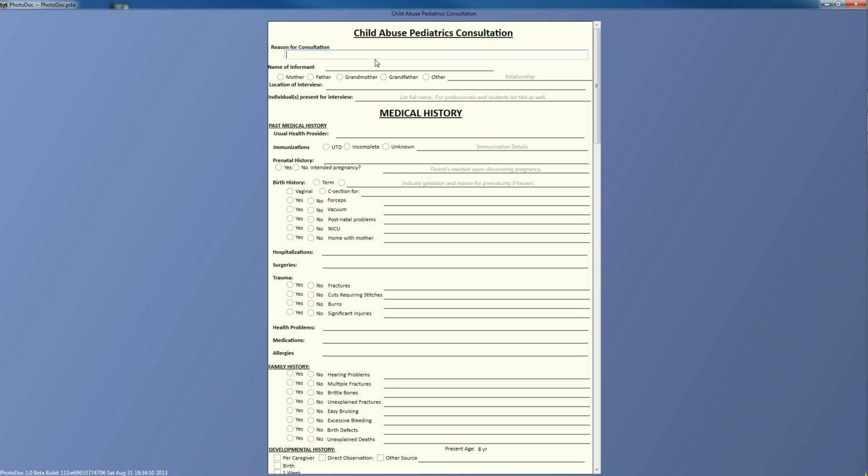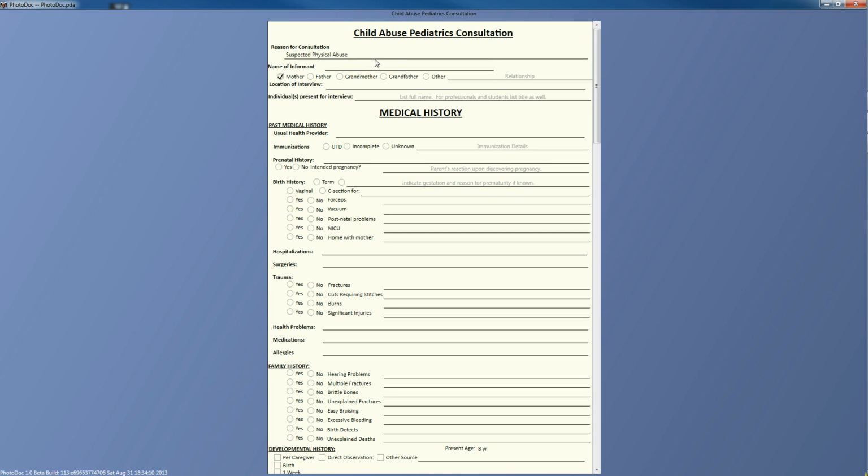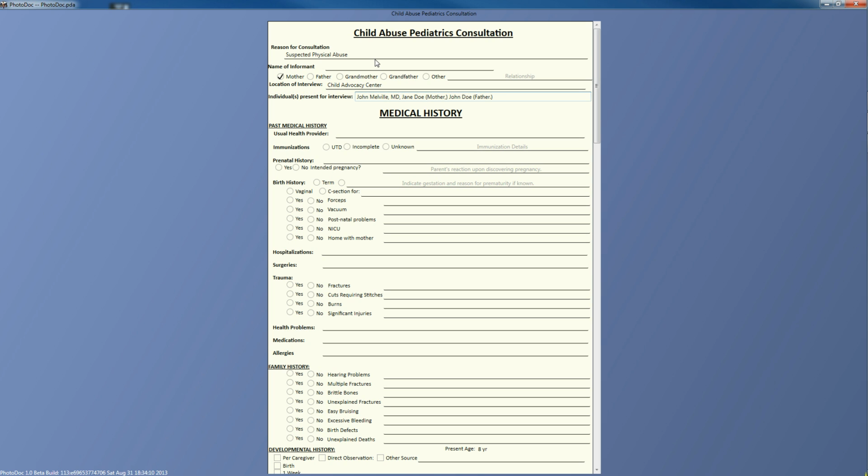Additional helps like macro phrases, checkboxes, default fields, and my favorite, copy whatever I wrote on the siblings chart, make it easy to complete much of the charting while I am doing the interview.